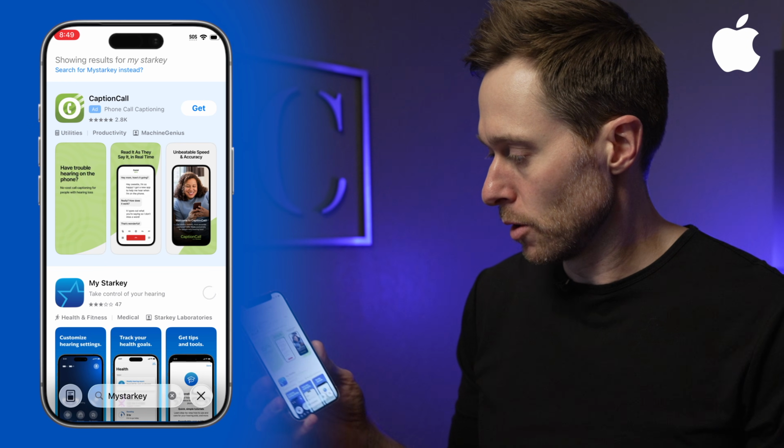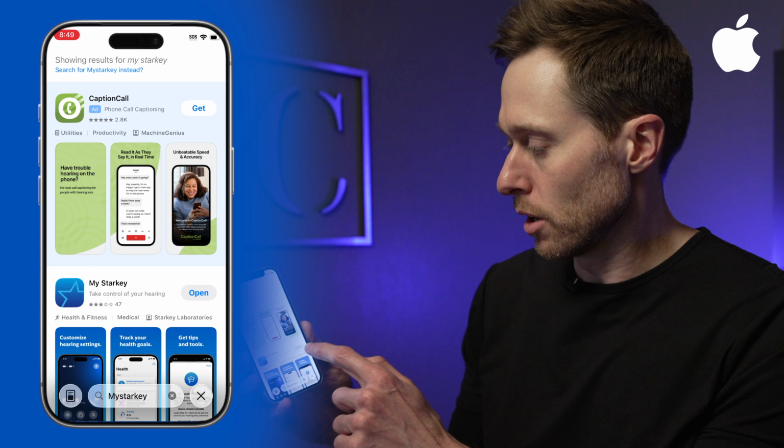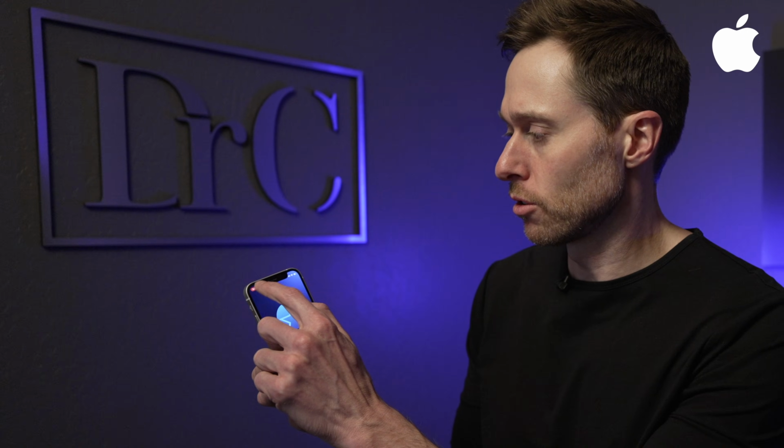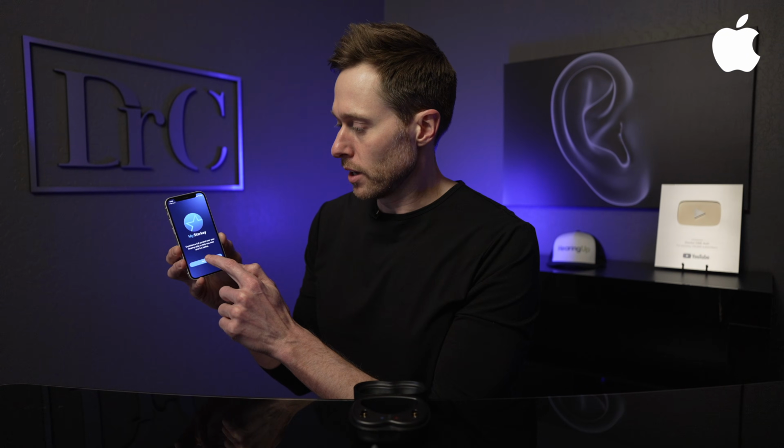There we go. I'm going to download the MyStarkey app. All right, there we go. We can go ahead and open the app now. Now it always runs into some issues when I'm screen recording, so I'm just going to turn off my screen record really quick. All right, let's go ahead and get started here.